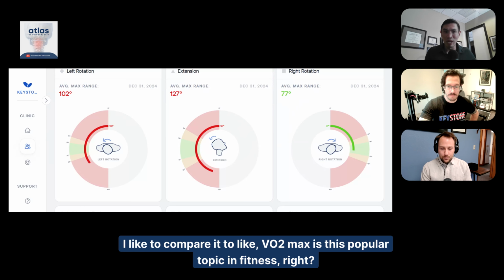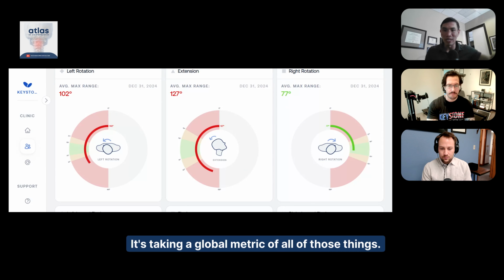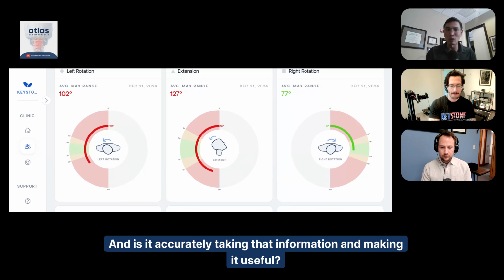And I like to compare it to VO2 max, which is this popular topic in fitness, right? VO2 max is not strictly just individualizing, testing your heart contractility. It's not just strictly looking at your mitochondrial capacity. It's taking a global metric of all of those things. And it's kind of the same way with both this and your butterfly test, because it's saying how well does your brain take in all this information that tells us about where our head is in space? And is it accurately taking that information and making it useful?